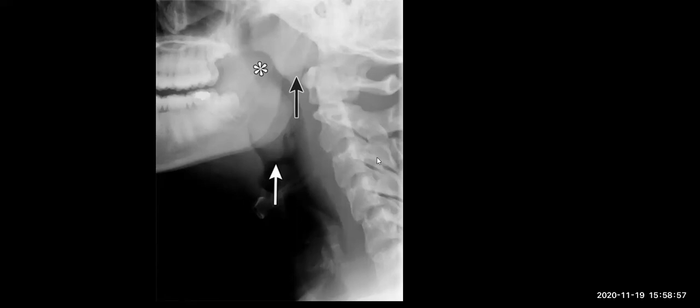This is commonly related to adenoid hypertrophy upon the nasopharynx. Lower down, which is also common to be seen in the pediatric age group, is the large tonsil, which is this one. Okay, so this is the lingual tonsil, which is enlarged here. Again, you can see the prevertebral soft tissue, because we will review these anatomical landmarks again and again in our presentation.